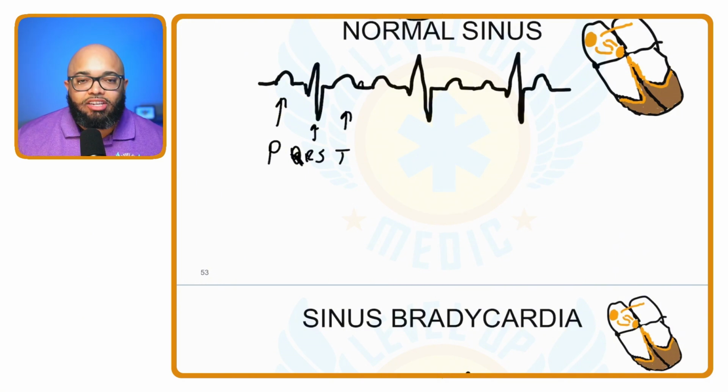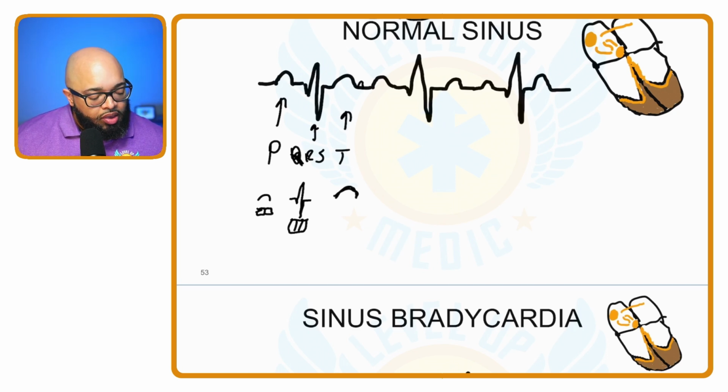The P wave, unless we're talking in leads aVR and V1, should be upright and rounded, and should take place within 2 little boxes. The QRS should be narrow, less than 3 little boxes. This is all normal. The T wave is going to be slightly larger than the P wave, but should also be upright and rounded, and go in the same direction as the QRS overall.